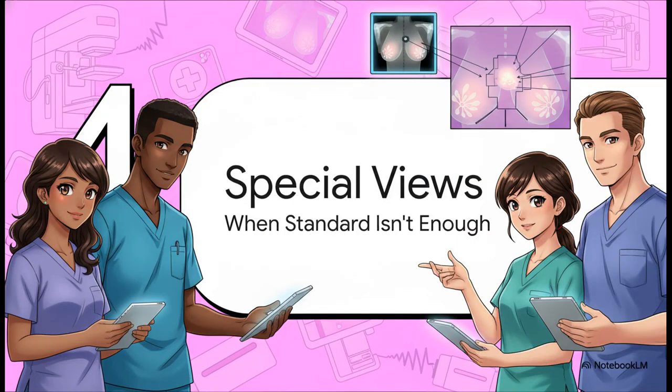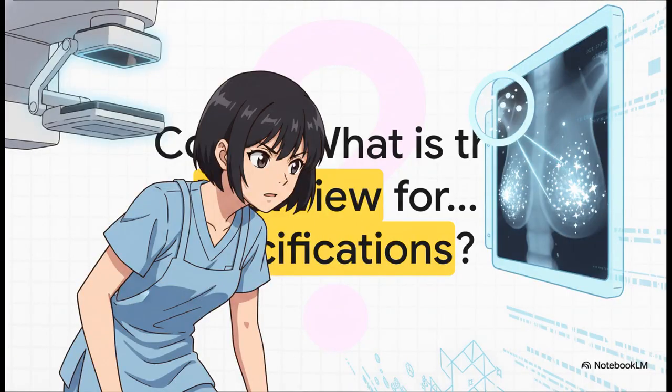But what happens when those two standard shots just aren't cutting it? What if they don't tell the whole story? Well, that's when radiologists call in the specialists, the special views. Each one is designed to solve a very specific problem. So let's try this out.